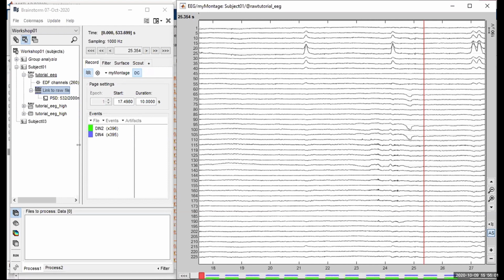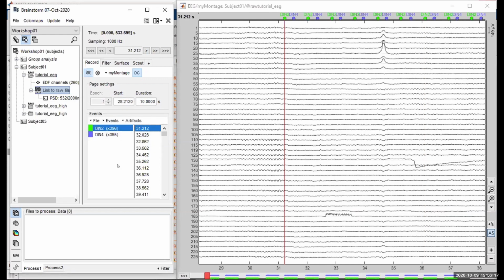Obviously, this is only sort of a problem for people that are using over 100 electrodes. So if you have less than that, maybe it's not as necessary. So these are montages. I think I've already sort of introduced you to events, but let me properly introduce you to these.